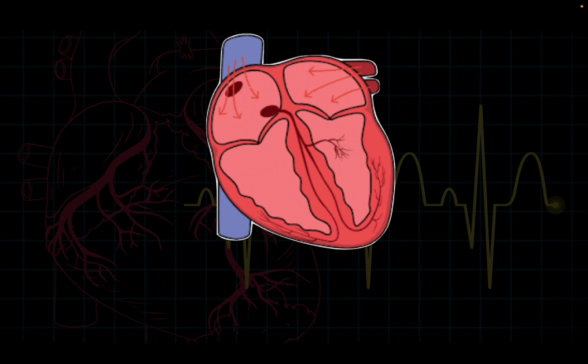That's because of these 300 pulses, the AV node is grabbing different ones every time, so that the timing from the atria down to the ventricles is constantly fluctuating. So their heart rate is irregular. You're not getting a P wave because you're not getting contraction of the atria. You're just getting that fibrillation of the atria. Now let's move on to the next rhythm.